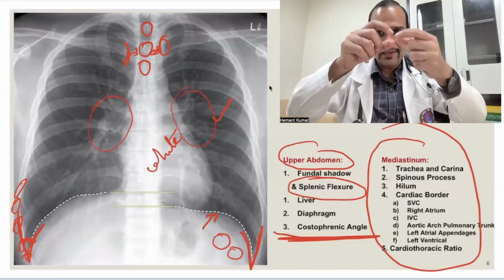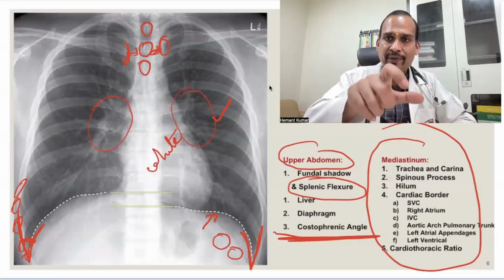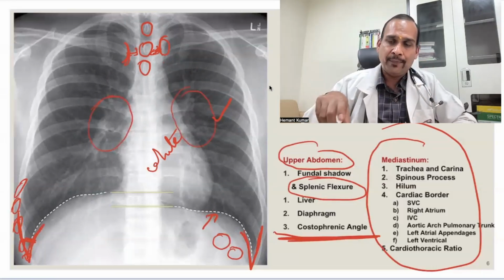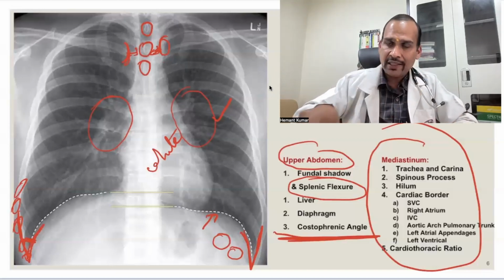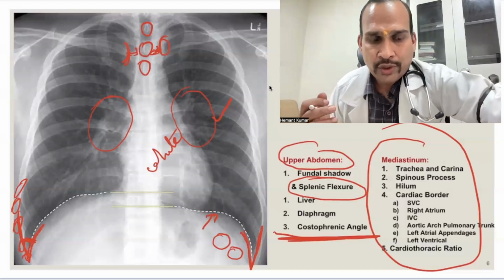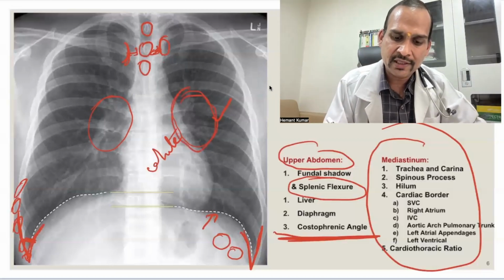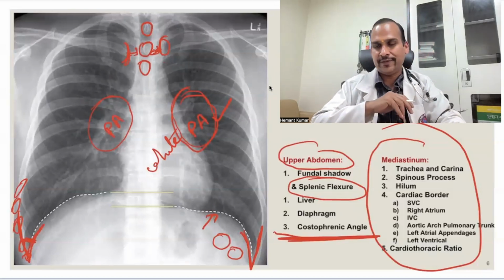When the trachea divides, the right main bronchus goes to the right lung and the left main bronchus goes to the left side, and there is the pulmonary artery too, right pulmonary artery and left pulmonary artery. So the pulmonary artery, bronchus, vein, lymph nodes and lymphatics enter the lung by the hilum. You can see in the hilar area there is a prominence. So what is this? This is the hilar pulmonary artery.